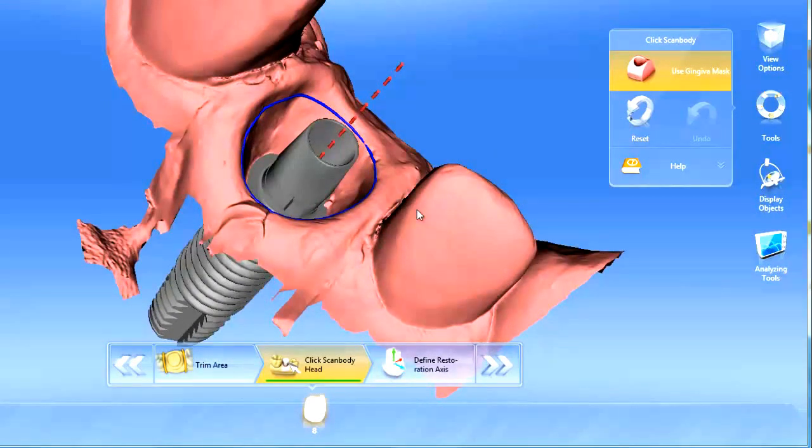It's, again, a nice tool to have. Make this the actual soft tissue model when you do your implants, so that you can be totally sure that the tie base is seated correctly. Again, if it's not down, everything's wrong.